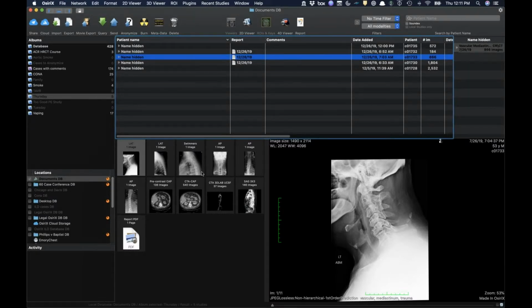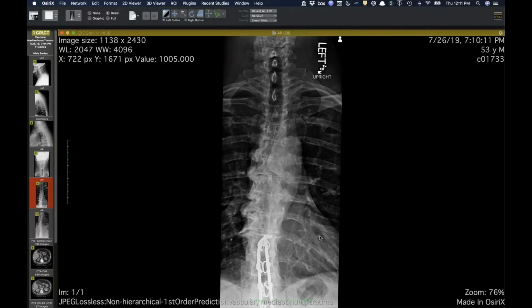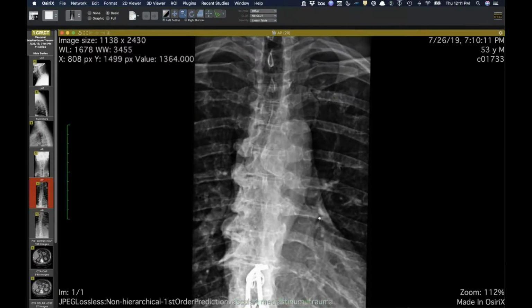Let's see, show you this. So I don't have a chest radiograph. I do have a spine radiograph, and I will let you guys look at this, and it's a nice eye test. There's something medial to the aortic arch. It looks like it's pushing the trachea over. Yeah, right here, good. And see there's a little calcium there.